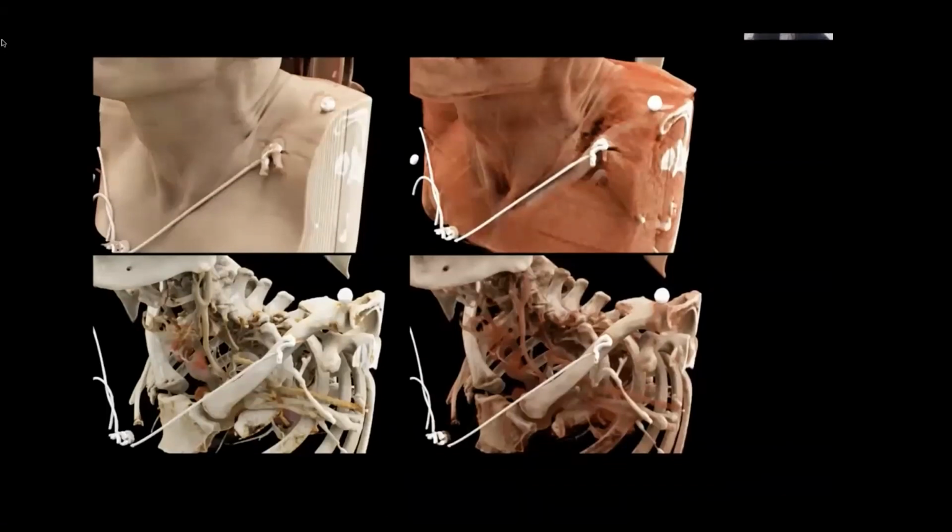Now, each of those individual small blocks that make up this large volume of tissue can be looked at in various ways. Traditionally, when you look at a CT scan, you're not actually looking directly at the tissue, and it's important to always bear that in mind. You're looking at a computer algorithm's depiction of the tissue, right?